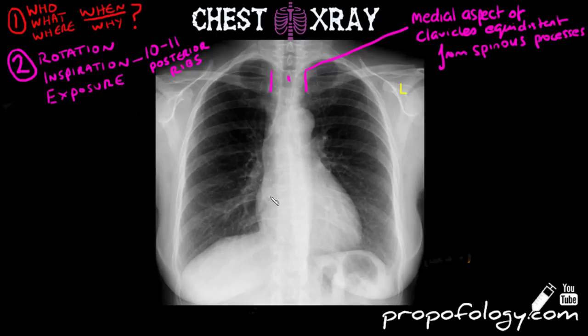And then you're going to adopt an A, B, C, D, E approach to interpreting chest X-rays. A obviously stands for airways, so we're talking about the trachea and its branches. You're talking about the bronchi and any airways that you can see distal to that. So you're going to trace it, you're going to look down either side, you're going to look in both lung fields as well.